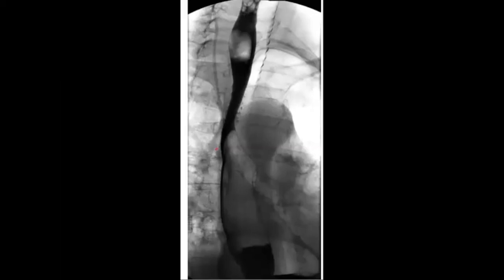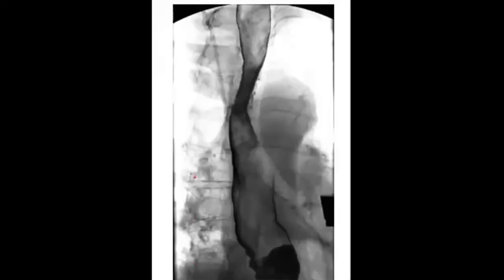So there is some narrowing in the mid esophagus, narrowed lumen, and I see some good descriptions. Look at this other image, and you can continue your description. So Ala, perfect, good description for the first image. Nermin, nice description. Ala, Huda. Now it is seen. I think now it's fine.